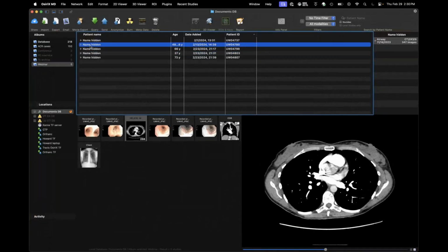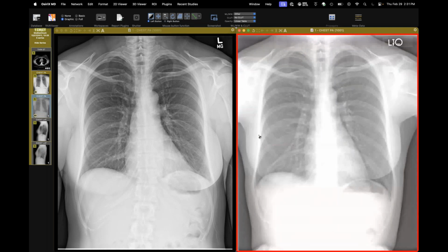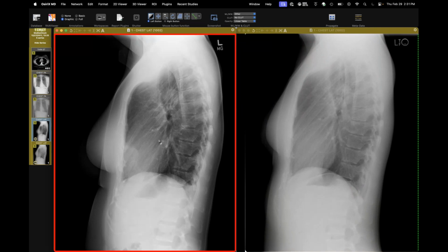This is a neat case. I thought this was a great call by somebody on the radiograph. This patient presented with chest pain, and there's the frontal radiograph, and here's a previous one for comparison, an older image. You can see it doesn't look terribly exciting. I'll bring in the laterals here, and this is where I thought someone made a really nice observation.